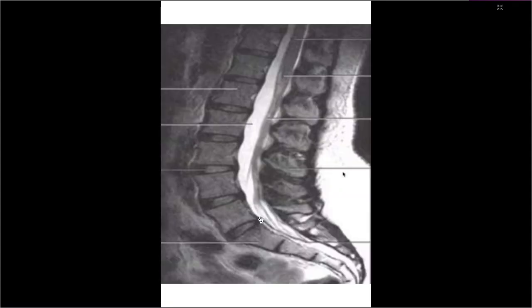Can you see the structure? Yes, sir. What is this view? This is a lateral, mid-sagittal view, an MRI of the lumbar spine. Lumbar spine lateral view, correct? Now tell me, which vertebra is this one?